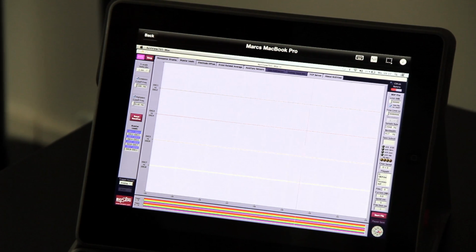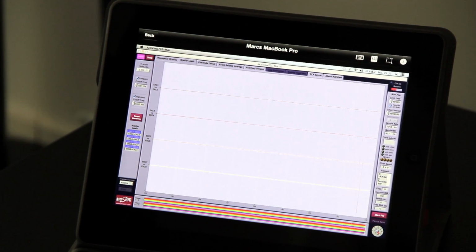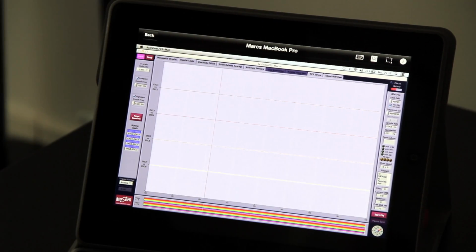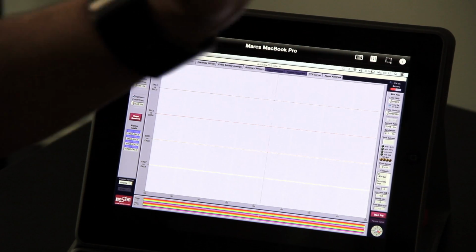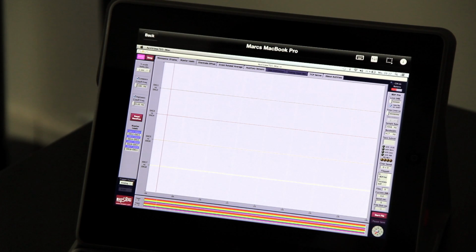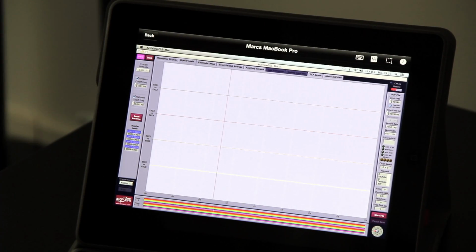ActiView is made in the house of BioSemi in Holland. Here at NEUROSPEC, we've made this movie to show people who are interested to run it on an iPad, and also to make sure that the community understands that this software is now downloadable for Mac, and so many people use Mac, and I think that's just great.